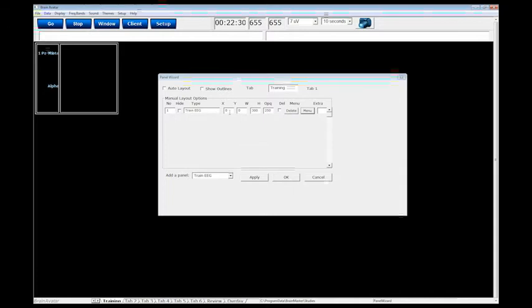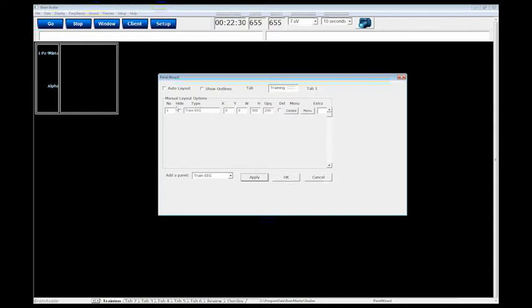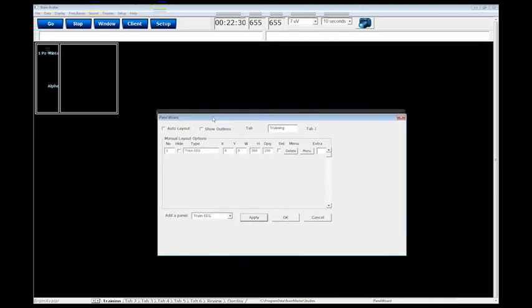So moving things around in this fashion, for example if I type 100 in the X coordinate right here, as you can see it moved over 100 pixels. The size, the shape, and location of all this is all pixel based. And if I type 0 again, it will move it back there.